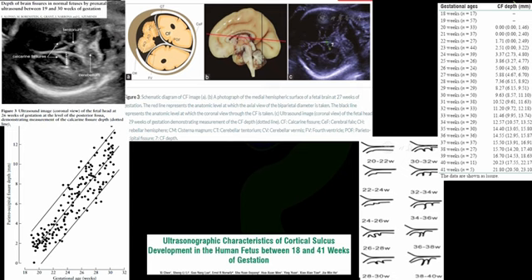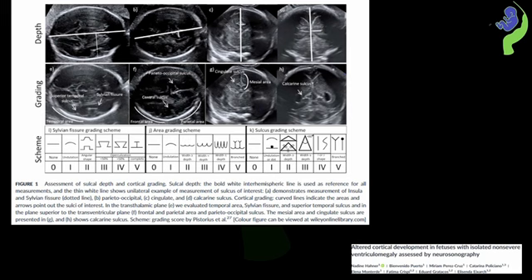Finally, this slide serves as a concise summary of both technique of grading and measurement of depth of various sulci and fissures. Insular depth, Sylvian fissure depth, depth of POF, calcarine sulcus and cingulate sulcus, everything is shown together, and even the grading along with the picture is given. I recommend you to take a screenshot of the slide and keep it readily available in your workspace so that it can be a really quick and invaluable reference during your practice, especially when you're going to assess the cortical maturation and development.